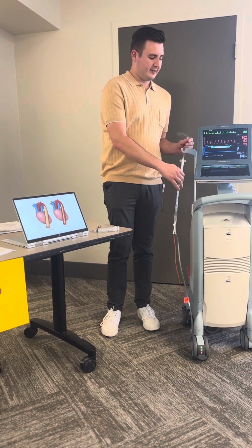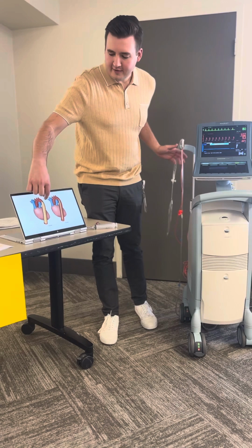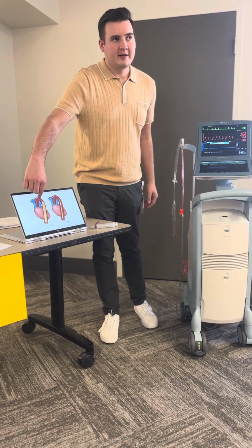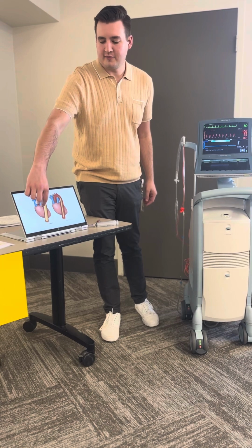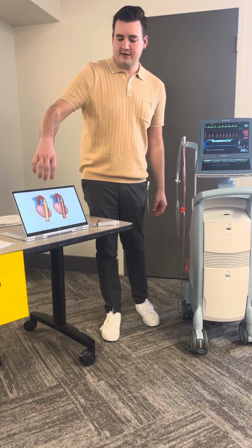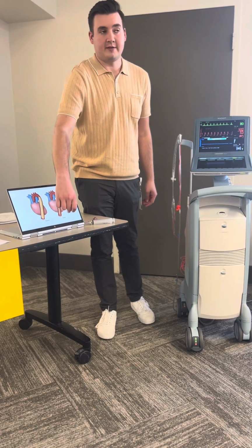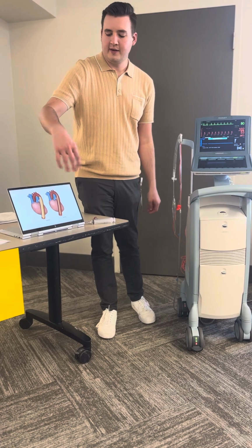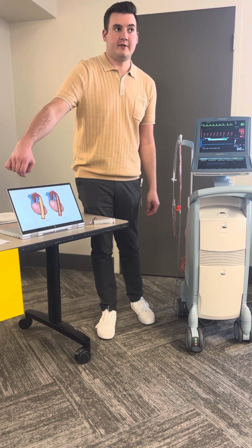And it inflates during diastole. And when it inflates, blood is displaced, so that way it's easier for the left ventricle during systole to perfuse more blood to the coronary arteries and to the rest of the body. During systole, the balloon deflates, so blood can go down the descending aorta to the rest of the body. But also when it inflates, blood is pushed up to the coronary arteries as well.